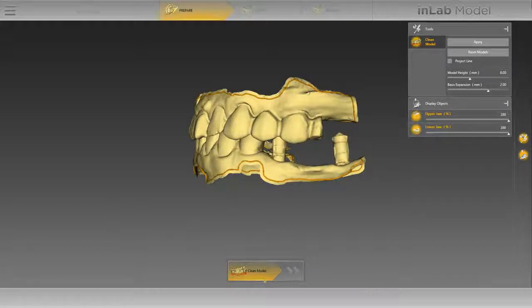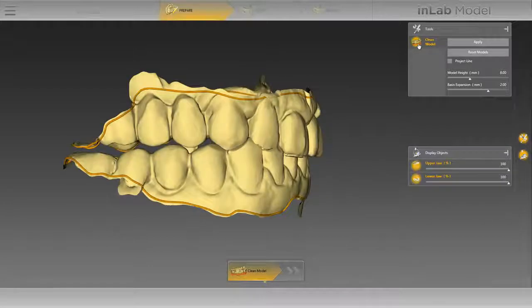Start by double-clicking on a point on the line, then single-click until you reach the point where you want to reconnect with the existing line or where you want to finish the correction. You can complete the correction by double-clicking again. In our case, we have already corrected the cut line of the upper jaw and lower jaw, and we can see here the end result.